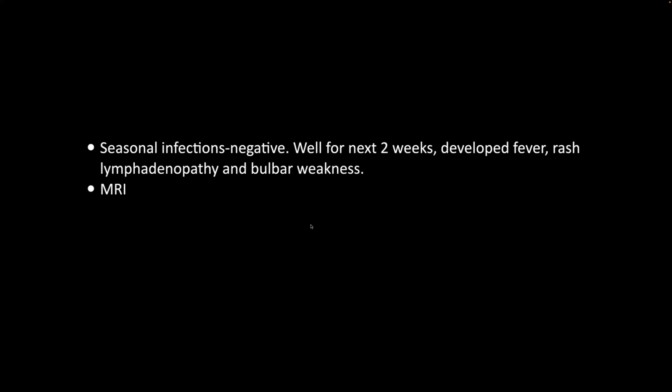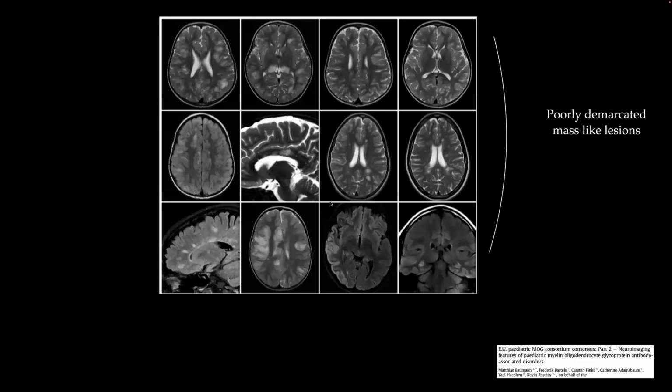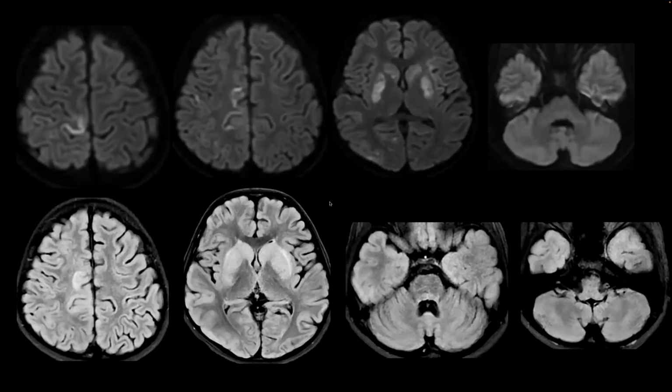So this is the second MRI, which Nihaal will show. Was the CSF PCR sent, Dr. Ved, after the first scan for any viral organisms? Yeah, HSV was sent, which was negative, just HSV. Okay, because the MRI doesn't look typically of HSV, more multifocal. Yeah. All right. So follow-up MRI. Now we have. And sorry, he also had EBV done, which was negative. EBV IgM in blood in the second admission. In the second, okay.